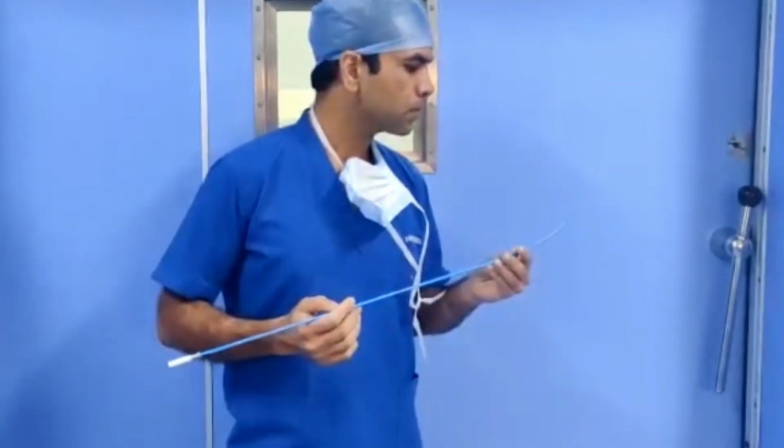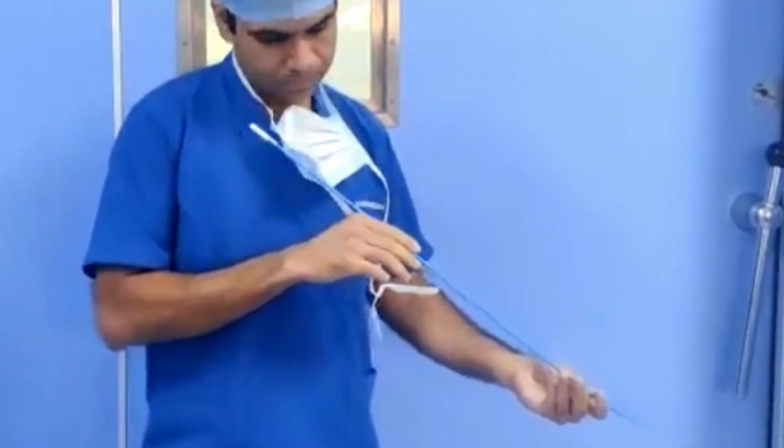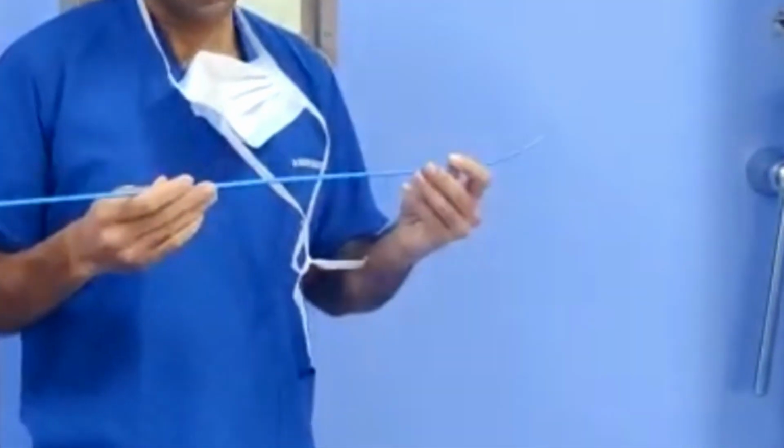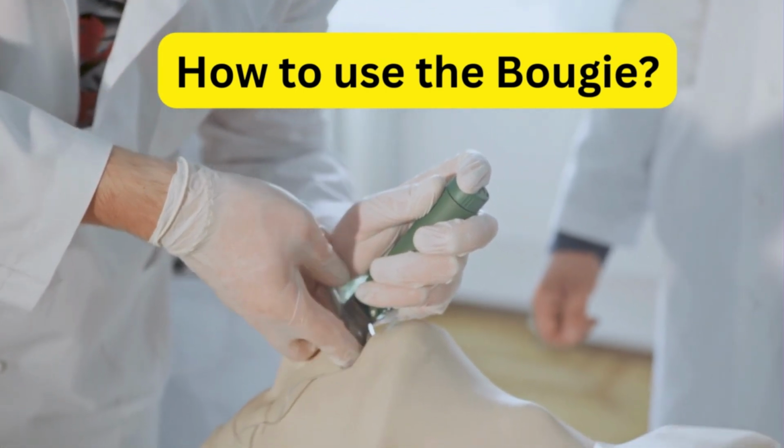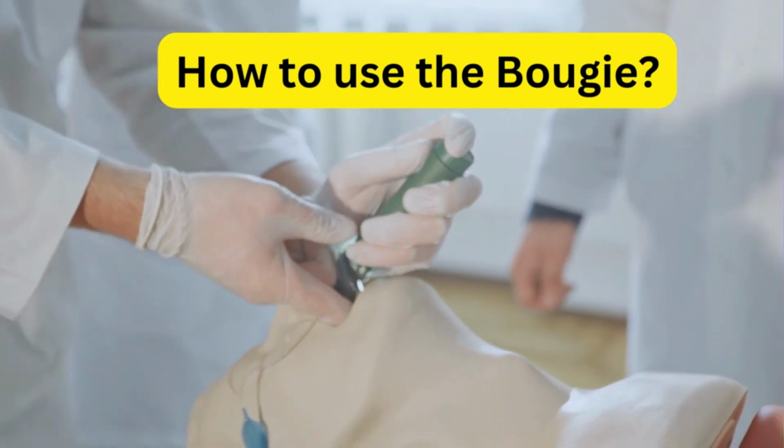And also the best device, if you ask me, in any crisis situation, the answer would be an LMA or a substitute like an iGel or a Blockbuster, which is coming up recently. But if you ask me what device I use most commonly and more regularly, it is a bougie. So today I'm going to tell you the practical tips and tricks to use the bougie, where it will be useful and where you should not use it, and how many times you should use it. That is what I'm going to cover in this particular video.